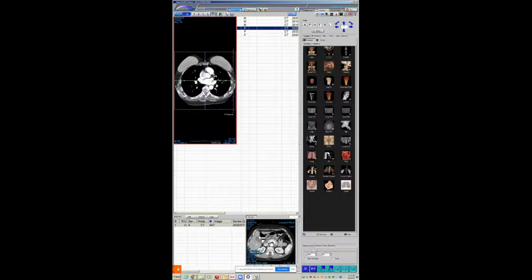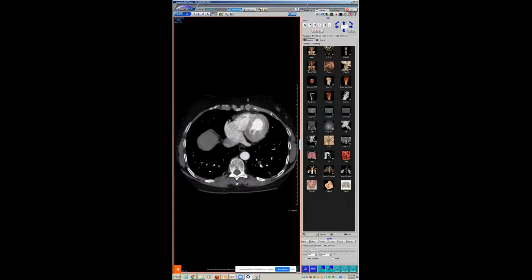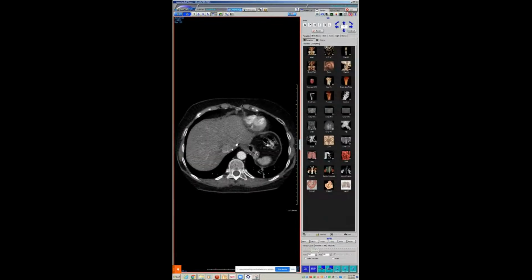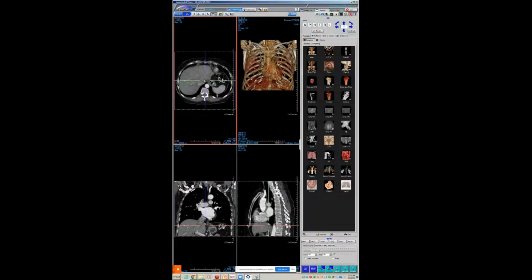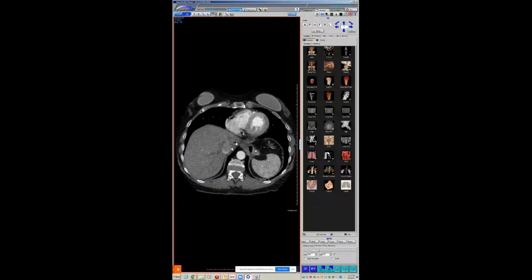This is, I don't remember what this is. Oh, yeah. I've seen some esophageal bronchial fistulas from various causes. This was a patient who had a gastric bypass in Mexico and came up with some fever and some issues. And I guess it's still esophageal, but I like to say it's more gastric.